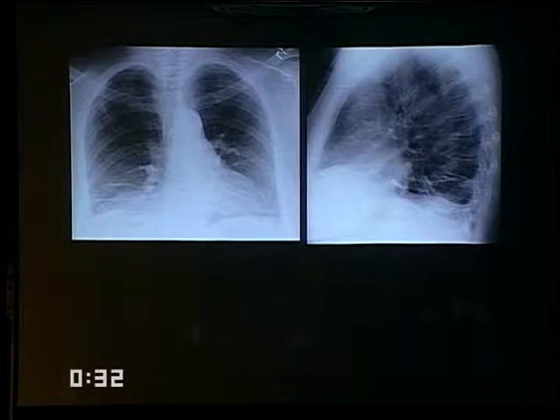I think it was suspected as being pneumonia. But the findings here are small lung volumes and just a lot of streaky opacities that, particularly on the lateral, look rather more like atelectasis than pneumonia. There's also blunting of the angle, which would suggest a pleural effusion. So while infection could look like this, aspiration could look like this, in a patient who's short of breath, acute symptoms, this should really raise one's index of suspicion for PE.